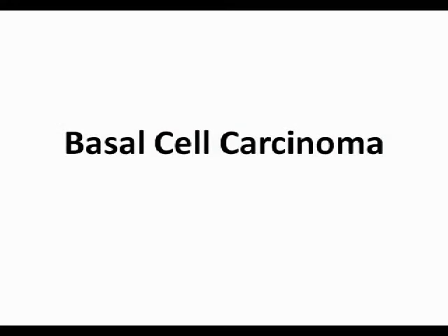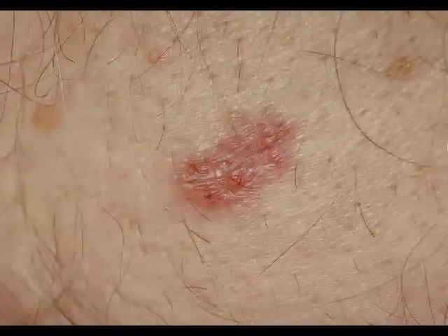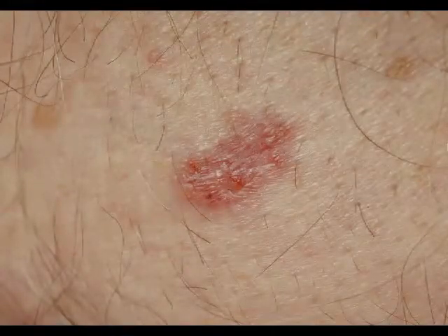Sometimes you do not see the typical branched vessels, especially for basal cell carcinomas on the trunk, flat basal cell carcinomas. Here is another example. You can see clinically ulceration. You suspect basal cell carcinoma. Dermatoscopically at first blush it's difficult to see which type of vessels are present, but if you look closely you can see that they are linear here and here and here. Some are straight, but some are not straight, some are serpentine, like here you can see serpentine vessels.